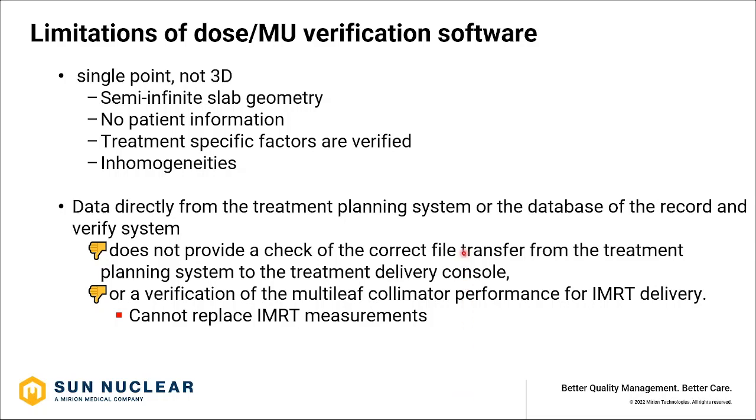Because the data comes directly from the treatment planning system or database of the record and verify system, the data does not provide a check of the correct file transfer from the treatment planning system to the treatment delivery console, nor does it verify any kind of MLC performance or IMRT deliveries.